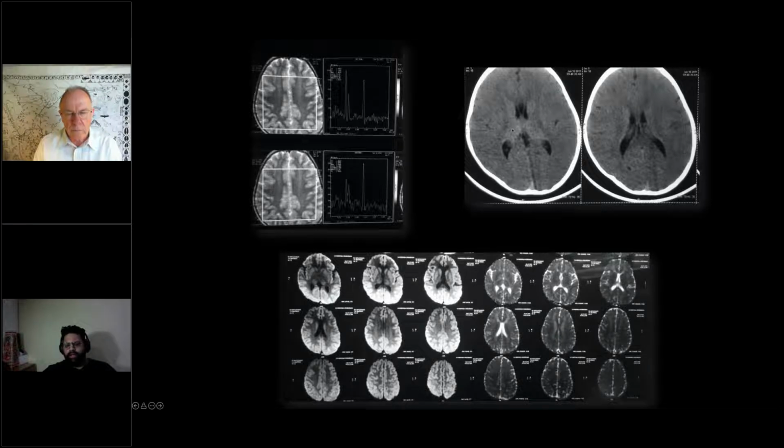On CT brain, the thalami appear slightly bright, or some hyperdensities are seen. No abnormalities on diffusion or ADC. On spectroscopy also, I could not appreciate any significant changes.